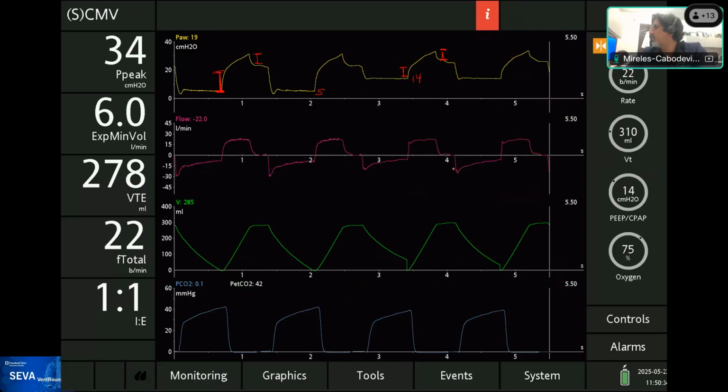Yeah, there you go. So Fernando put it: it needs more pressure to overcome the airway opening pressure. This is a pattern that you need to recognize. When you see a discrepant inspiratory step up in a patient on a square waveform, comparing the step up versus the difference between plateau and peak, when there's a major discrepancy, that is a hint that this patient has an airway opening pressure.